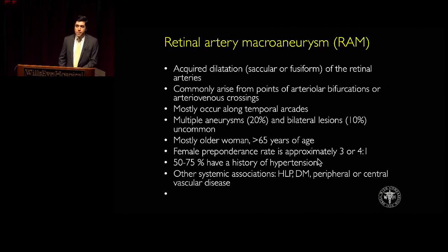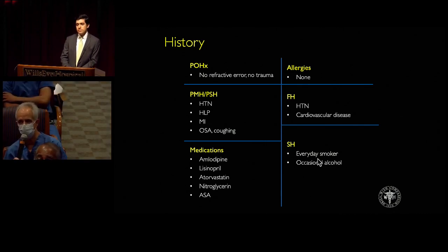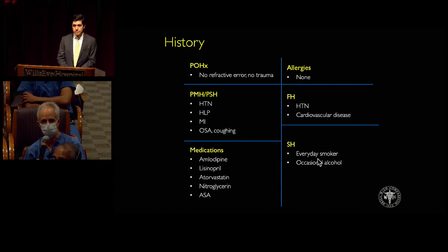Abtin, I just want to point out that although an aneurysm certainly is very high on the differential to explain the hemorrhaging, the symptoms and so forth, we can't ignore the peripheral microaneurysms in both eyes. So something else is going on.